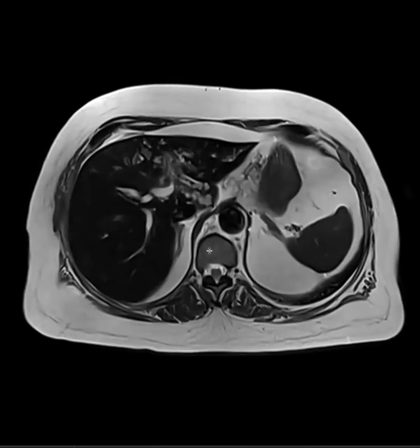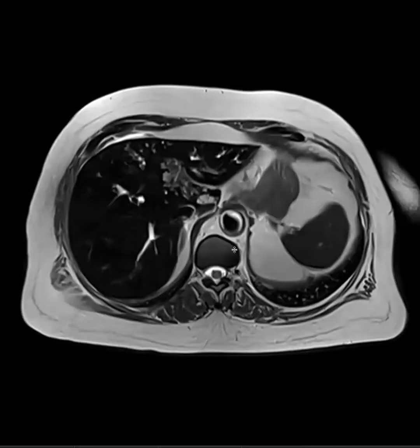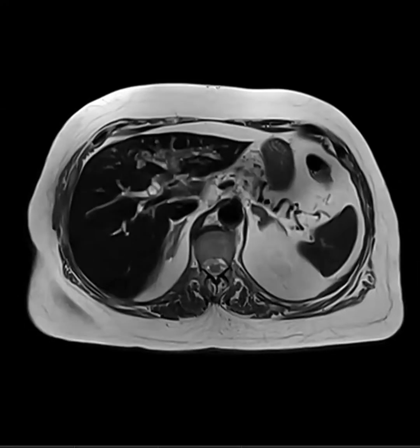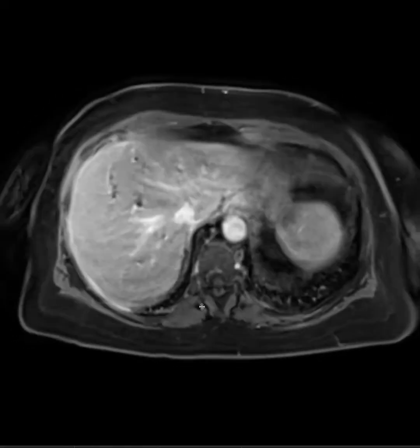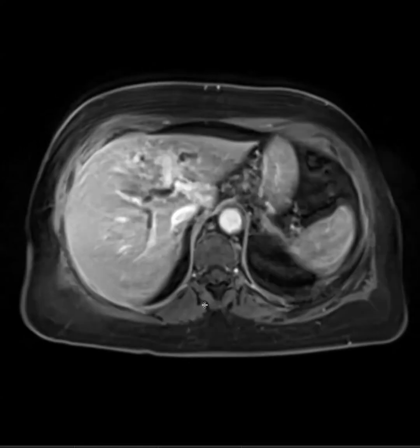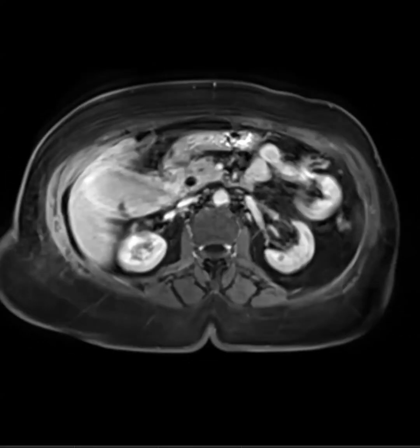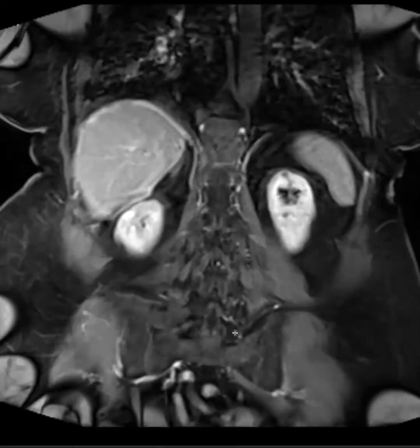Whoa, what's all that stuff in the left? Like, is it in the portal vein? Okay, let me give you the bile post-con. I think it's bile ducts, but I'll give you the 5 minutes. It's all enhancing. The portal vein, let's see if we can look at the coronals. Well, just the gallbladder thing looked to me almost like what I was talking about, ICPN.